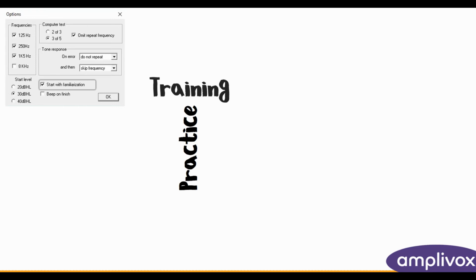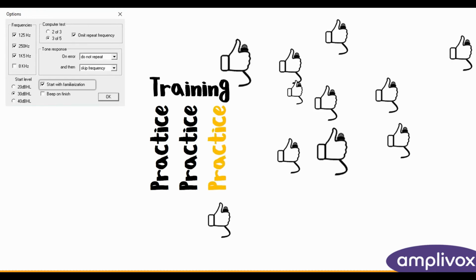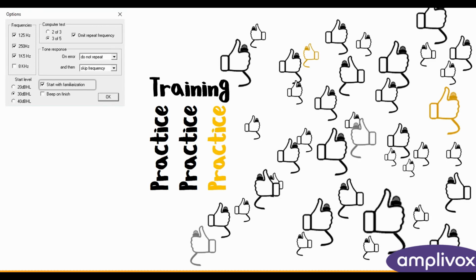Starting with familiarization will give the test subject some training sequences before the actual test phase will start. This allows the patient to get used to the test flow and feel more secure, leading to more reliable responses.